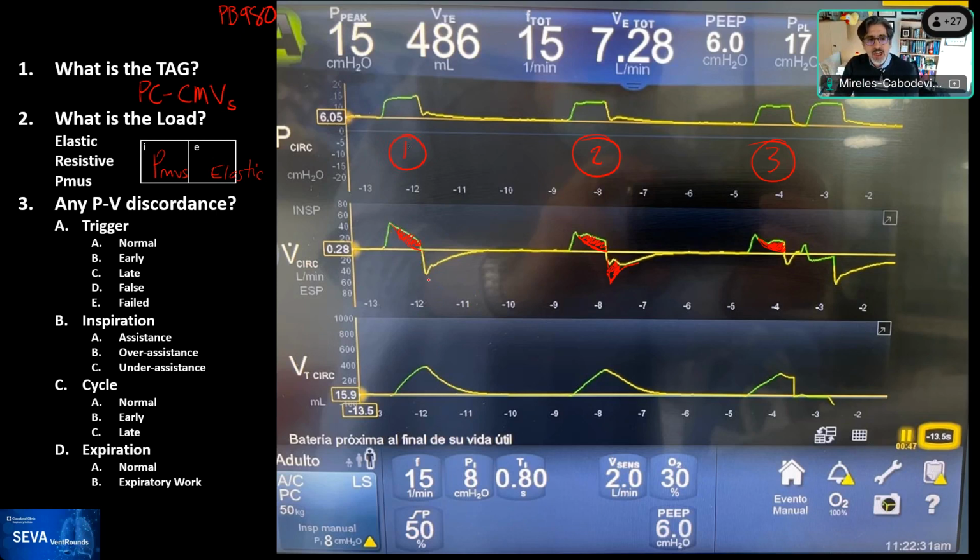But in general terms, the load that you see during expiration is the same manifestation as during inspiration. So the way that this decays is likely the way that it should decay in here. Not always, but it's a good rule of thumb. So the area that goes above that is essentially the patient's work of breathing manifested there. And so you can see it here and here. Rob, you put a comment there. Do you want to talk a little bit more about that?